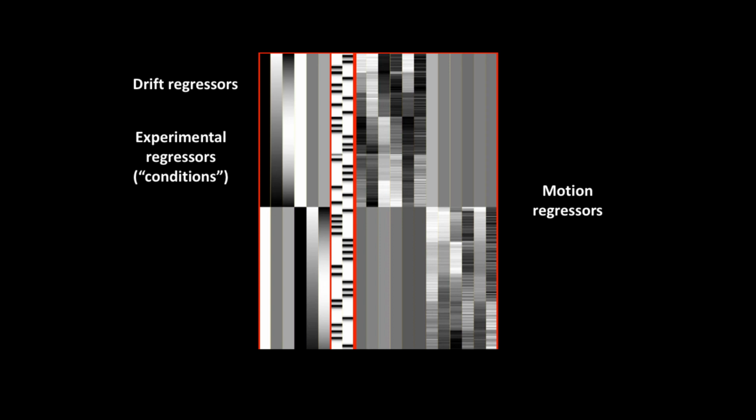The ones at the bottom are the second run. Yeah, it may be just because I was parceling, this is the first run, this is the second run, and just filled in these with something else. Could be wrong, but that's my reading of it. Yeah, that makes sense. They changed this recently. It used to be that these would all be in the same column. They've changed that recently for reasons I'm not entirely sure about. But yeah, it's kind of the same thing over here. I don't think that these represent actual motion regressors for run one. They're some kind of placeholder. Right. That makes sense.